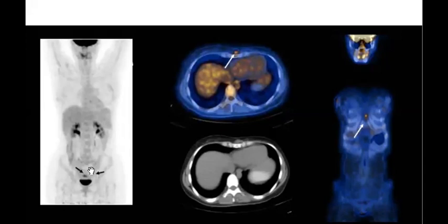Yes, this one is ovarian, and this one is uterine. So it can have normal uptake, even as you see that the patient didn't have any metastasis. That's why. But it can be pathological, sure, if this patient, for example, has metastasis in the ovary, Krukenberg. But to be honest, in these cases you have much higher uptake, and probably you will find other metastases. Okay.